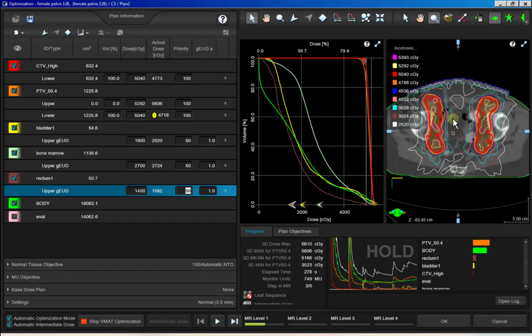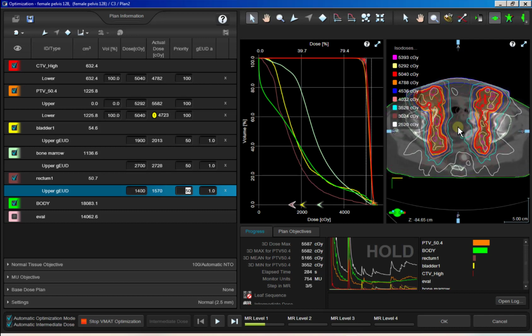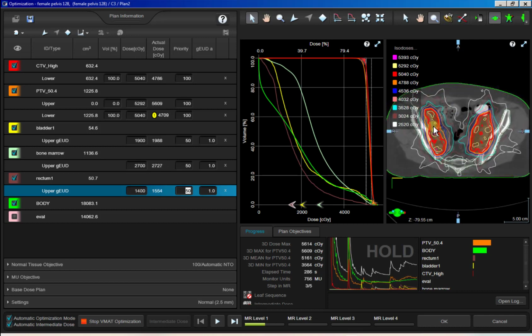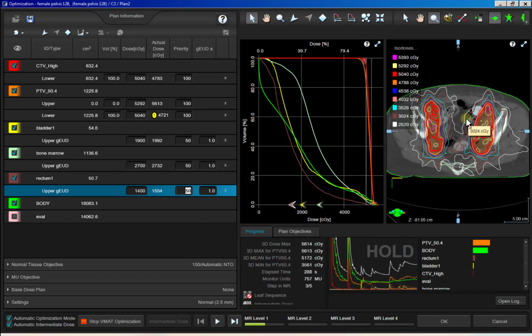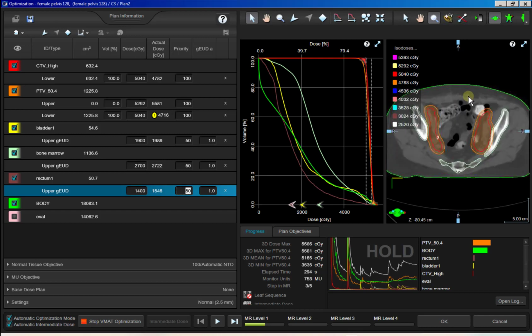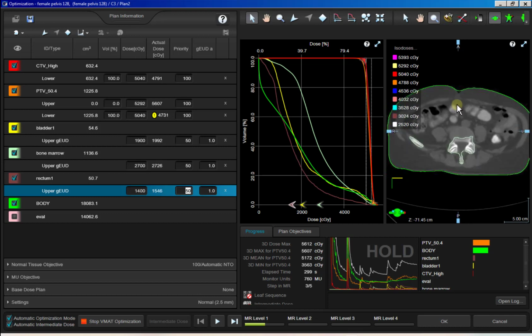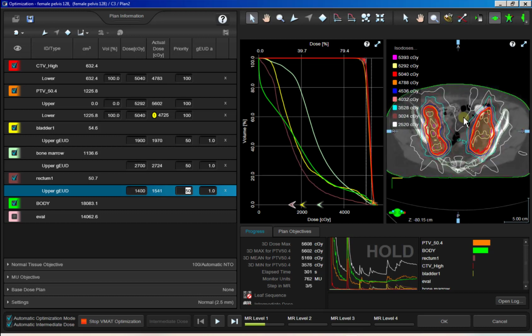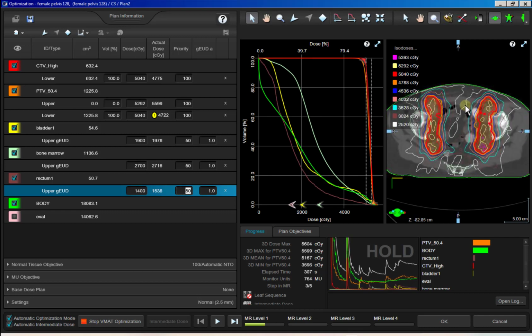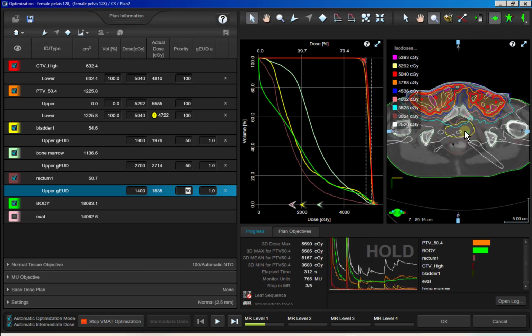But your lower isodose lines, the general shape of all your isodose lines and the general conformality of your plan is something you should look at. And if you start to see any weird streaking in your high dose lines, like 90, 95, 100, if any of those start to streak out or become unconformal, which it's not really doing in this plan, everything still looks pretty good. You can see this little spike starting to form. But basically, the harder we push, eventually it would start doing that.